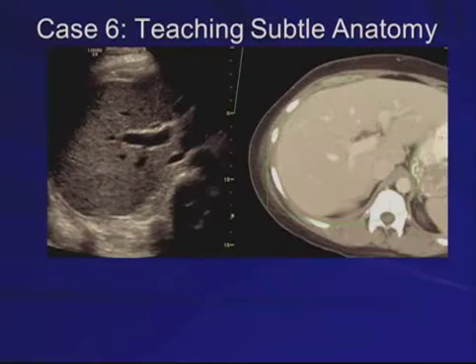So here's a case in which you can use it as a teaching situation. Normally, we don't think about the adrenal as being something that we teach readily by ultrasound, and especially in many patients, it's difficult to see the adrenal. However, on CT, you can virtually always see the adrenal.